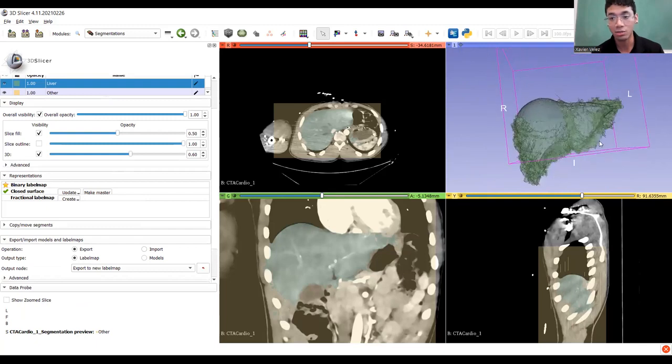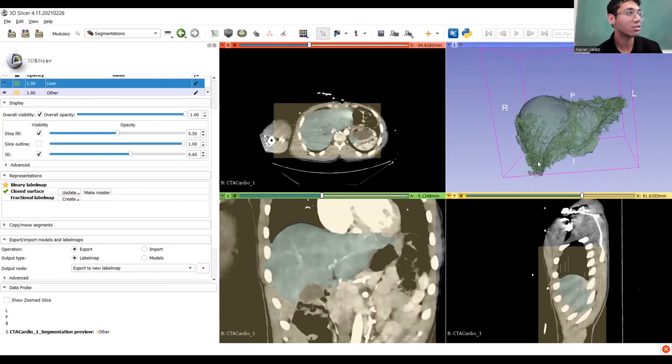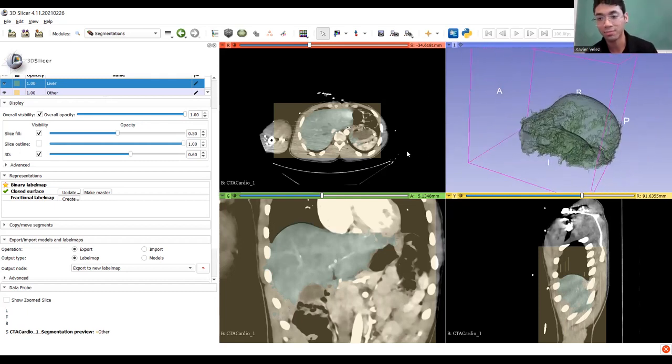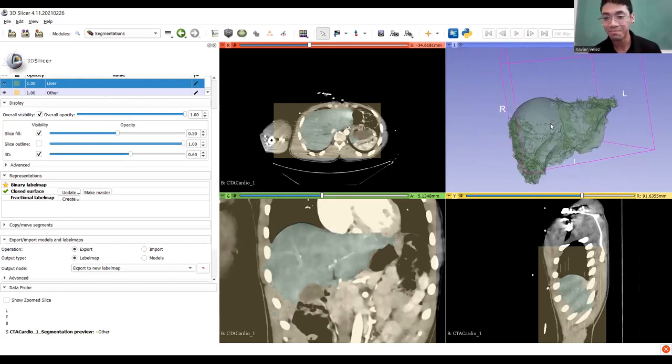And it is going to look terrible. It looks so bad. Like, what is that? What on earth? You're probably thinking, man, I thought I was doing a good job. This looks terrible. But don't worry, we're going to fix it. It's going to turn out better by the end of it.